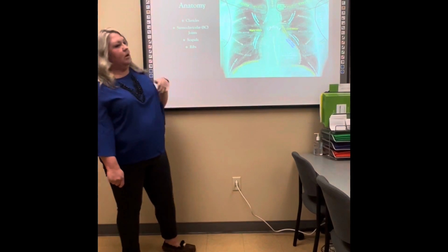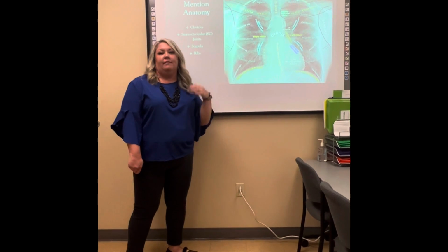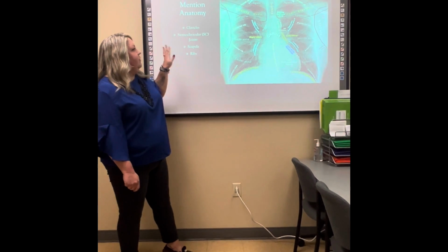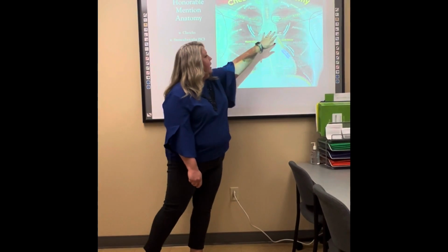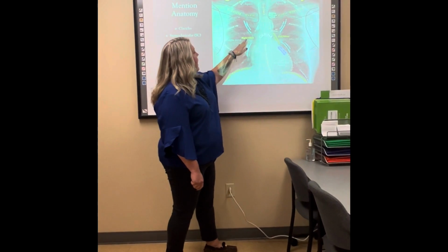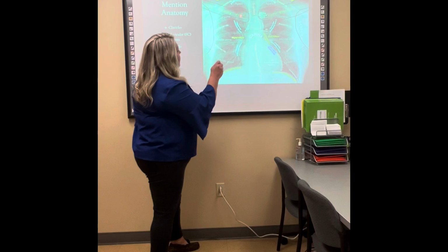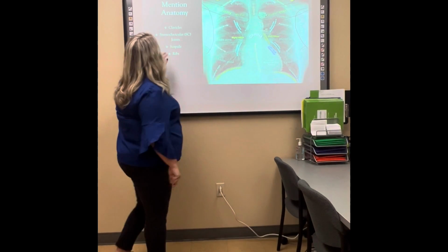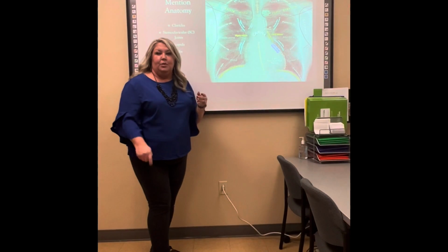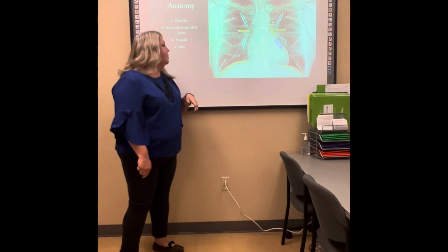Okay, this is just some honorable mention anatomy, some things that we need to make sure that we know where they are so we can evaluate our chest radiographs later on. So some honorable mention first is our clavicles, here and here, mainly the sternal end, or the end that's closer to the sternum. You can see here where the sternum and the clavicles meet, this little junction here, that's our sternoclavicular joint, or honorable mention number 2 on our list. Again, in image evaluation, we'll see that these are equal distance apart from the vertebral column to make sure that we're not rotated one way or another.